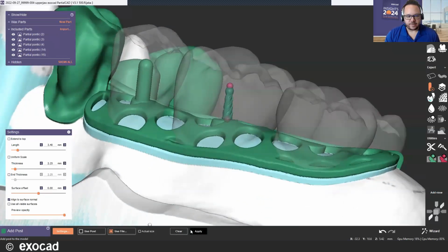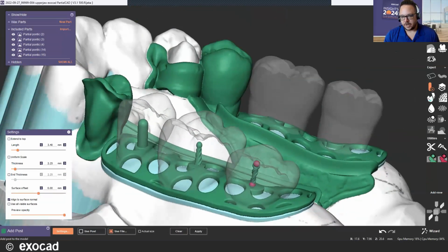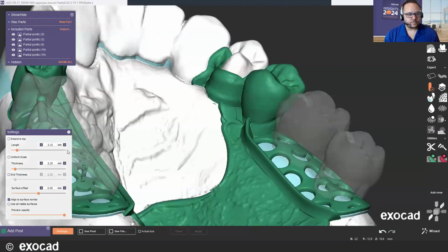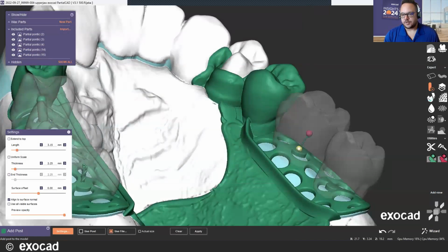So we'll go ahead and apply that one. And then we'll move forward to the next style. So we have this devil's head here. We can go ahead and zoom in, show you that style. Okay, so I know we got a couple of twisted options there.